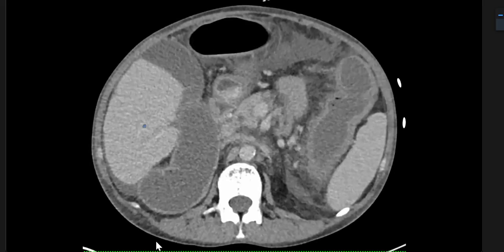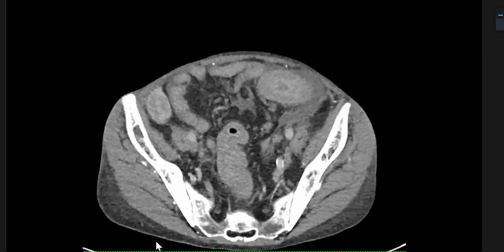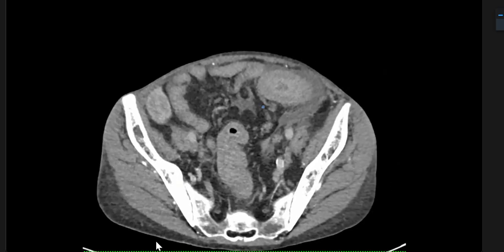First and foremost, we're worried about the pain. You can clearly see there are thickened bowel loops, thickened sigmoid. When the wall is thickened, the peristalsis gets a bit sluggish, and there's a good chance of colocolic intussusception because the synchronization is gone.